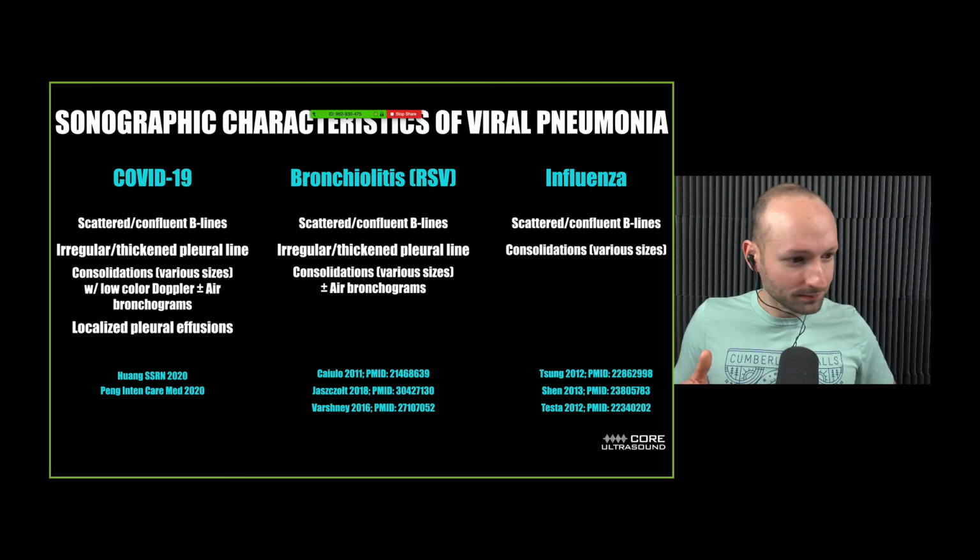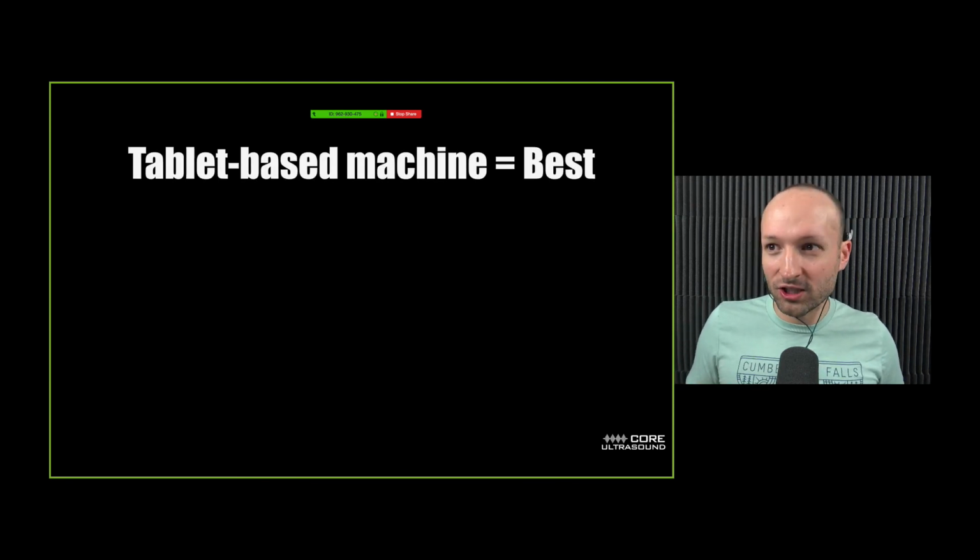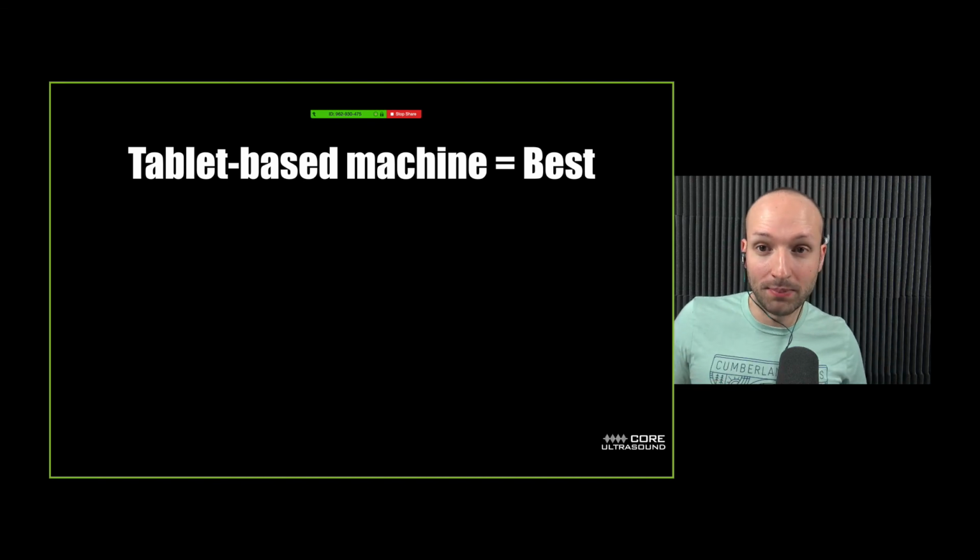Now, as far as how to actually use ultrasound, probably the best way to do it is to use a tablet-based machine.